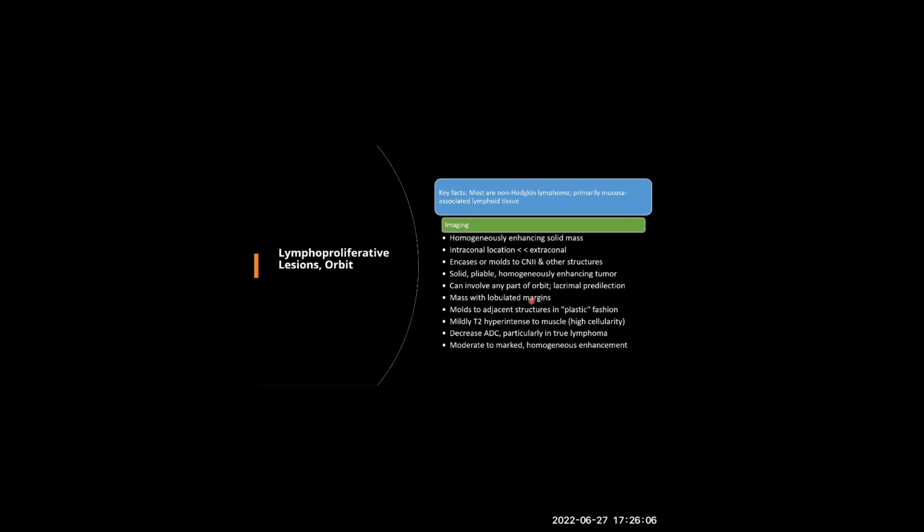The problem is when the pseudotumor is in the regression phase, when it is not flared. But clinically, when the pseudotumor is flared, you can differentiate both of them. Both of them come with proptosis, but here it is not painful like the pseudotumor.